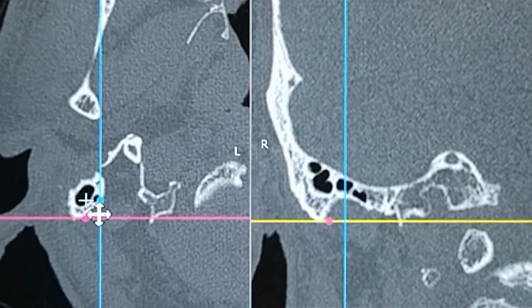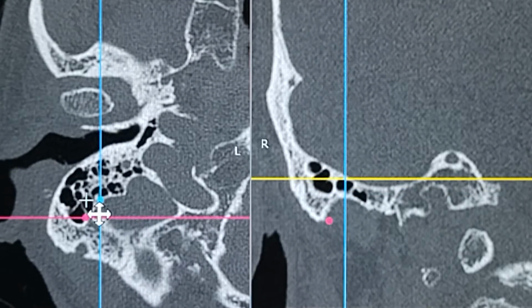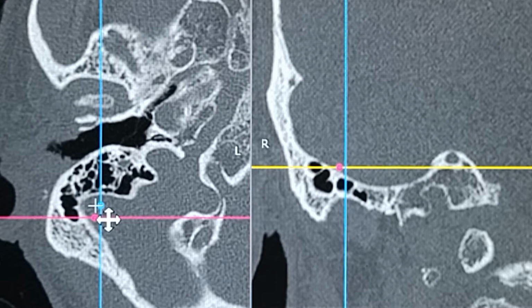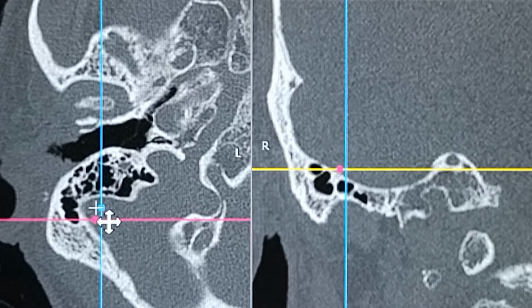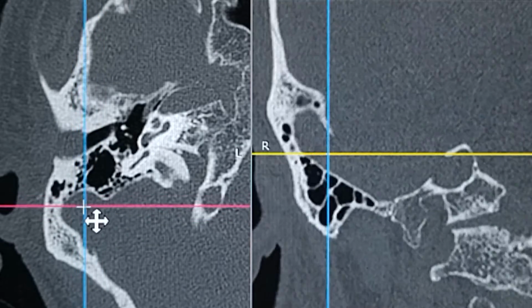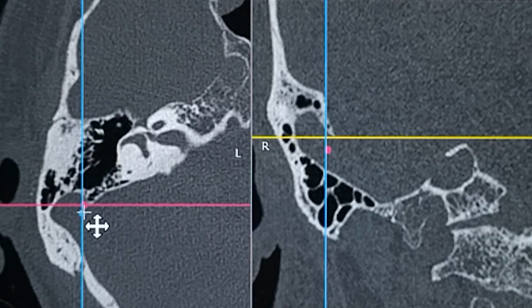So that's the mastoid tip coming into the picture right now, the entire trabecular meshwork, and then you can start seeing the appearance of the sinus area. Now this bulge you can see over here, that's the sigmoid sinus, which is the inferior and the most posterior structure of all. You can keep following that on the coronal section as well. You can see that's the sigmoid sinus on the coronal sections.